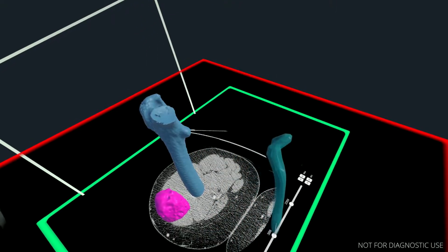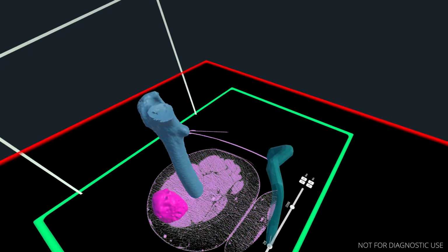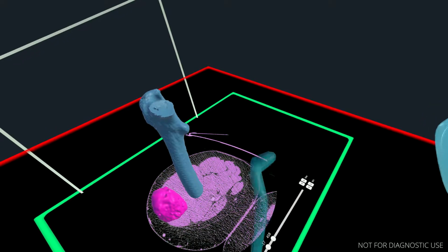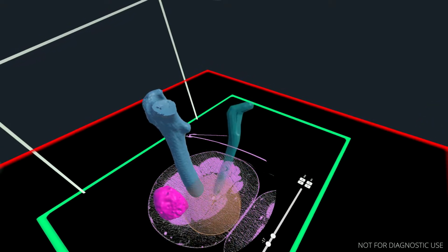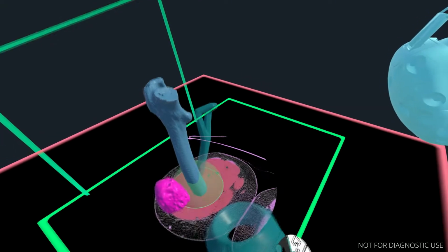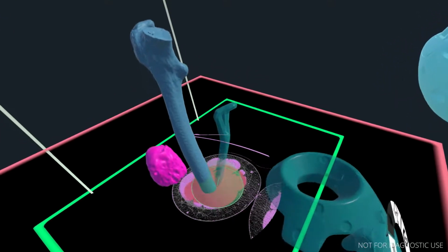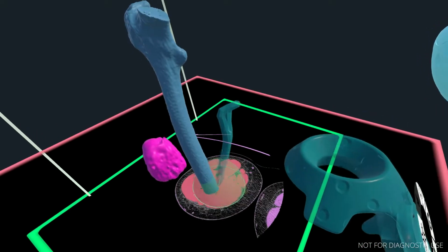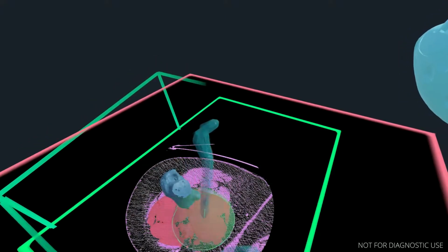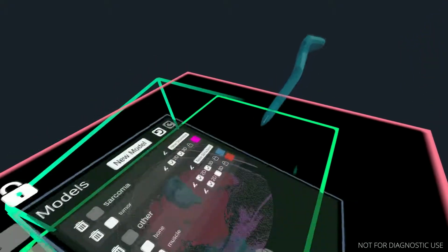And so we'll want a new threshold that includes the muscle here. Let's use reduced noise for this. And see, yep, that does quite a good job. We don't really care about the fine details of the different muscle fibers because we're just doing it to give some context to the tumor. So this is about as high as I'll go.